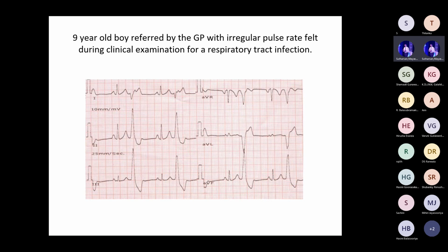So you can see normal PQRST complexes, and soon after the normal T wave, you can see what? An abnormal QRS complex, and the next P wave occurrence is delayed. So it's premature ventricular ectopics. When I look at this ECG, I can say it is coming from the RVOT, but you don't have to know that much. Anyway, if you can identify these, it's enough.